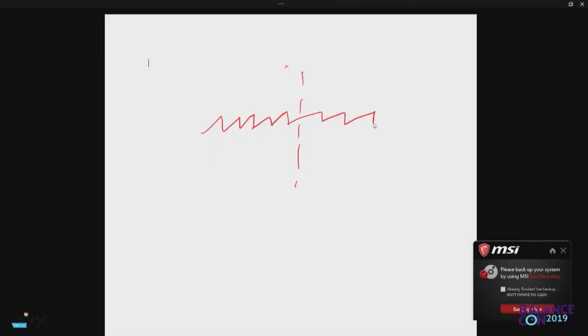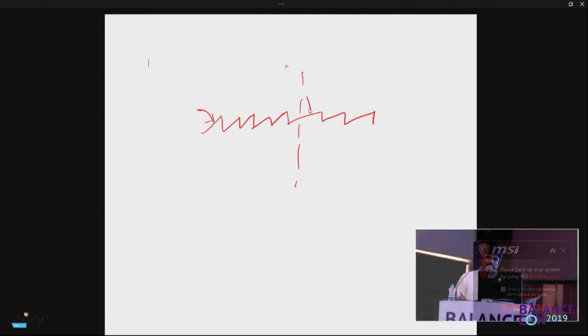So here what you see is what is written in gray. There is intense nystagmus. Then the green segment is the time where fixation was induced. So beyond a certain line, fixation was induced. And suddenly, what is the difference between the slope of this slow phase versus the slope of this slow phase?